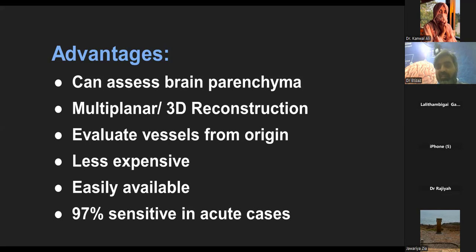Multiplanar and 3D reconstruction is there. For vascular lesions, 3D reconstruction is very important. It gives some ideas similar to DSA, digital subtraction angiography.